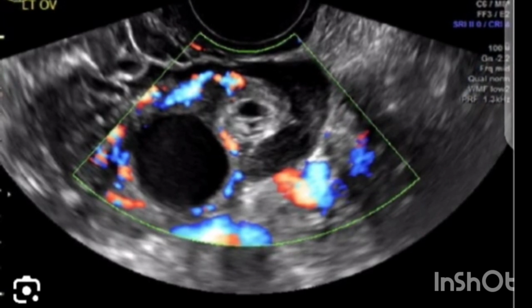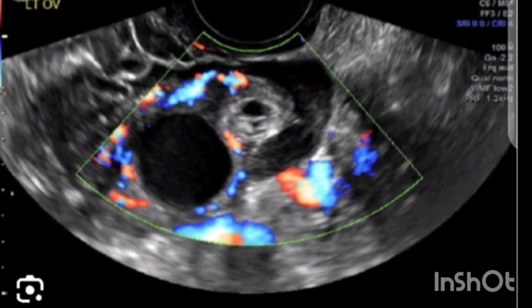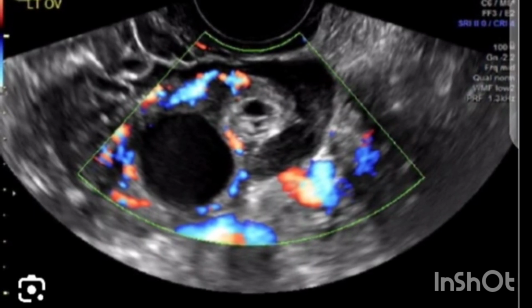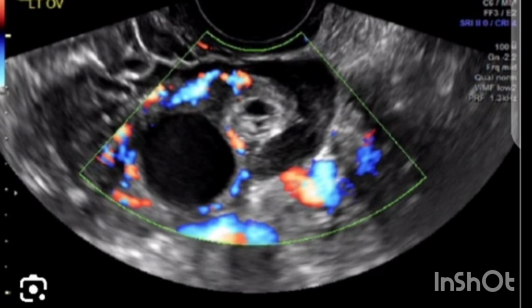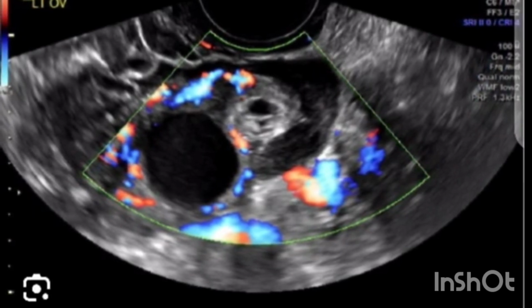Nearly a third of women present with hemodynamic instability because of rupture. Diagnosis is based on the classic description of a cyst with a white echogenic outer ring. Ovarian ectopic pregnancies are most often treated surgically.